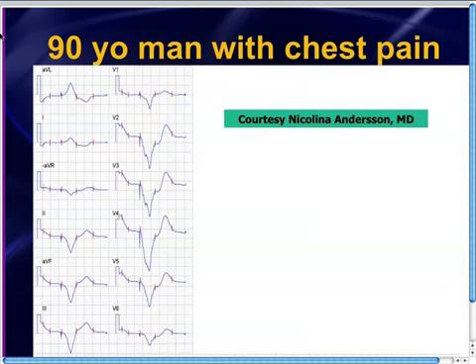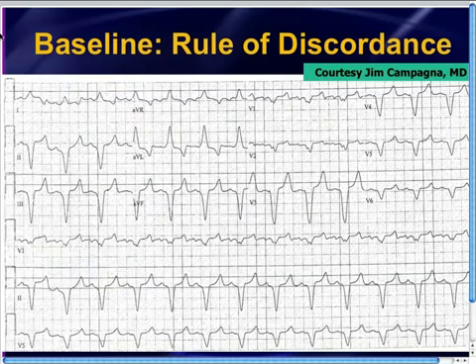We actually reviewed acute MI in the presence of a pacemaker back on February 12th, 2012, so just a few months ago we reviewed this topic, and for those of you that recall, this is one of the EKGs that we reviewed at that time. So you can go back and review the February 12th EKG videocast that we did back then. But this was another really nice case to just review.